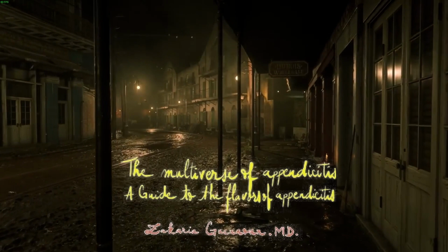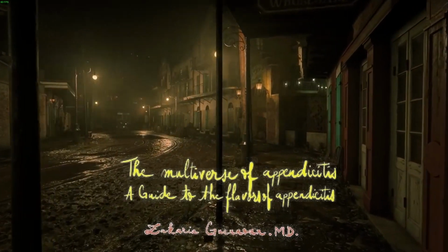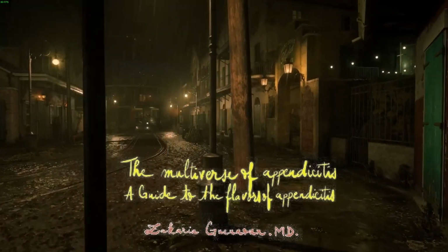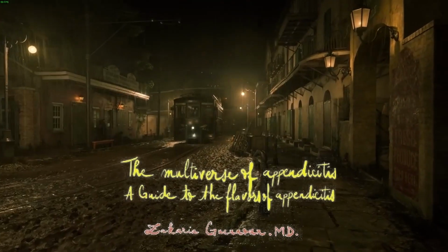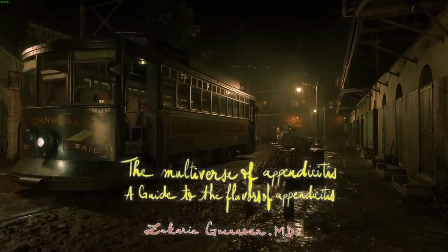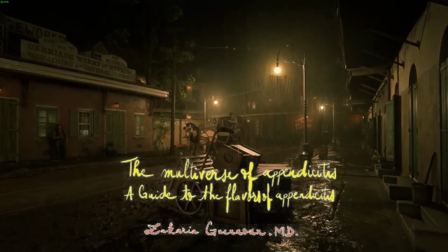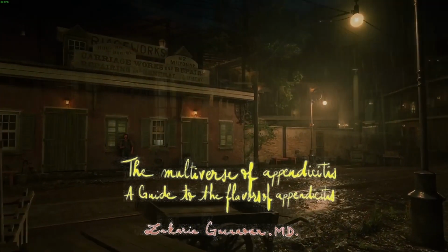On occasion, the appendicitis can be chronic, relapsing, and also resolving. It can occur when non-surgical management is attempted for whatever reason, and the CT is not distinguishable from early acute appendicitis. Also, appendicitis can be associated with rotation anomalies like intestinal malrotation and situs inversus in such a way that the appendix will be visualized on the left side and not the usual right side of the abdomen, but with the same CT findings.